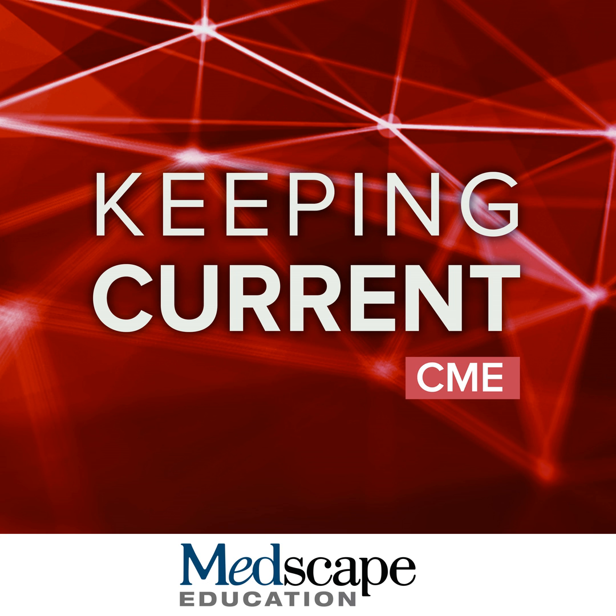Now, thankfully, we have an improvement on this version, which is called phase sensitive inversion recovery imaging, where we can also reconstruct the images with a phase sensitive reconstruction algorithm that allows us to always null the myocardium. So you can see here, even in this set of images, which is the same acquisition, when the TI is too low, with the PSIR images, you always get nulling of signal from the normal myocardium. And this greatly simplifies the acquisition with delayed enhanced imaging.